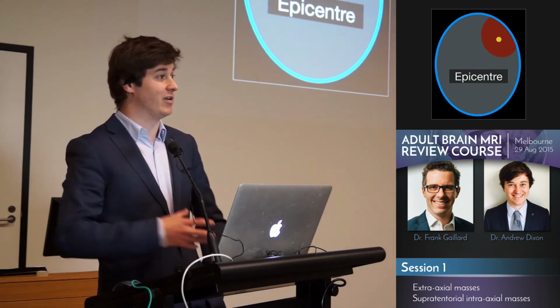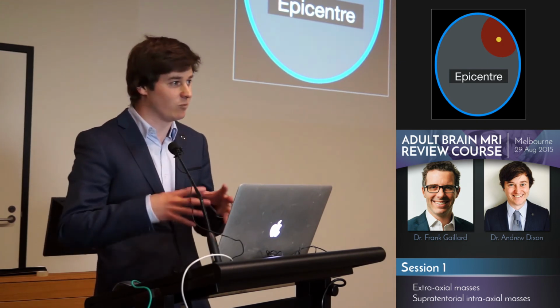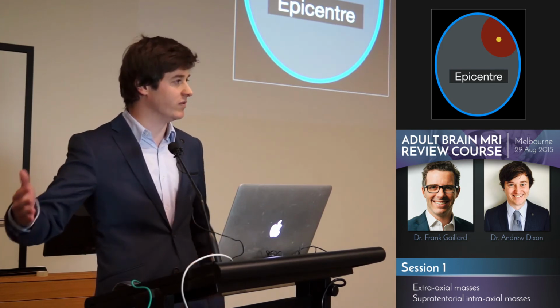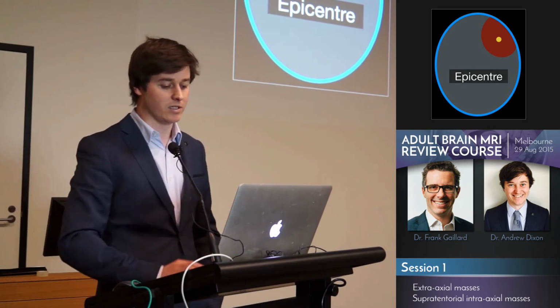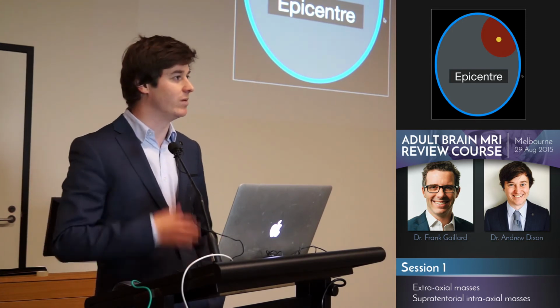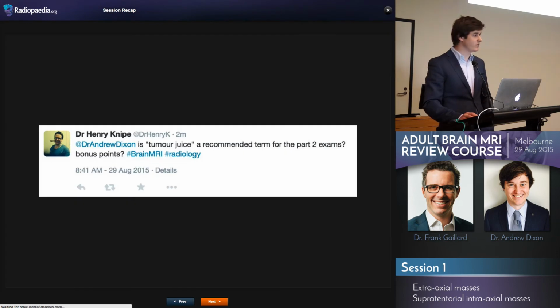And I think when you see a really, really big one, it's very hard not to think that it's sitting right inside the brain. Okay, but you've got to remember that it may have come from the periphery and it's growing in. Okay, so the epicenter not being relevant, I've never heard that expressed in that kind of way before, so I think that's something to take away. We did get a little bit of Twitter activity.